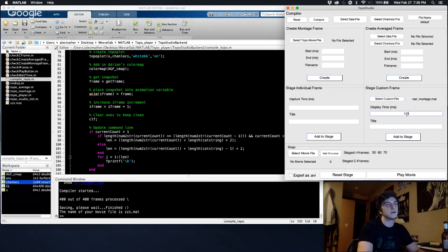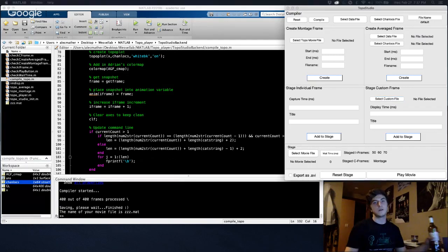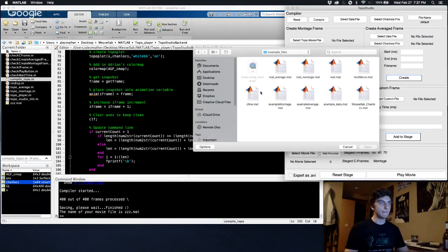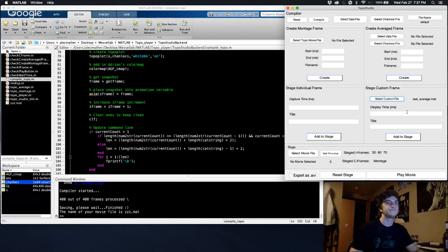We'll display it at 100. Our montage. Stage it. And then back here, real average. Display it at 150 and call it our average.